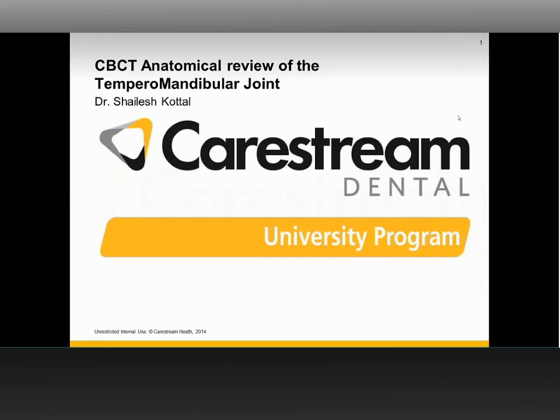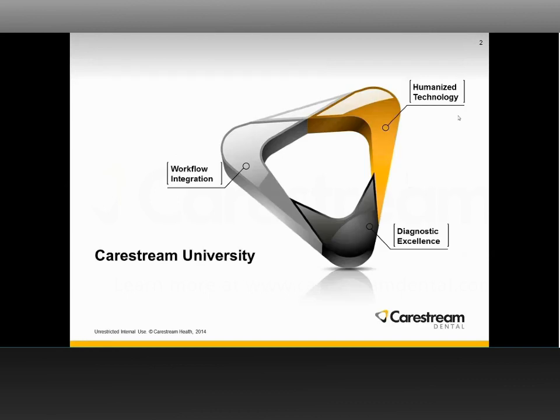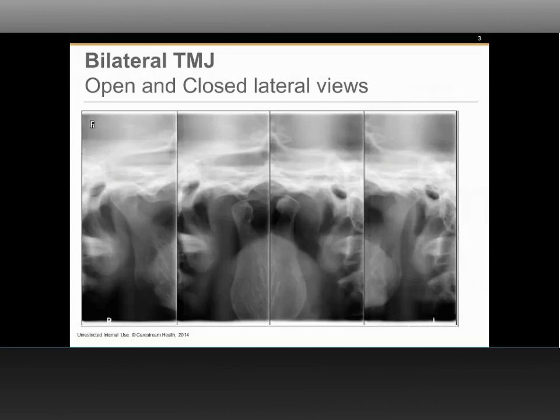Dr. Kottal, before we jump into 3D imaging, I've noticed that many clinicians still use 2D imaging for evaluation of the TMJ. Is that all that's needed? For example, as this image here, does 2D imaging alone suffice for TMJ evaluation?